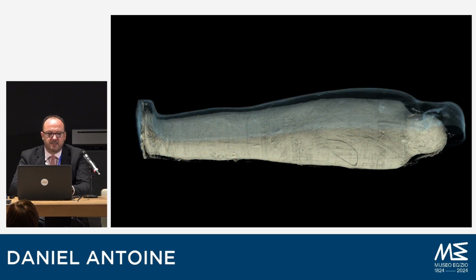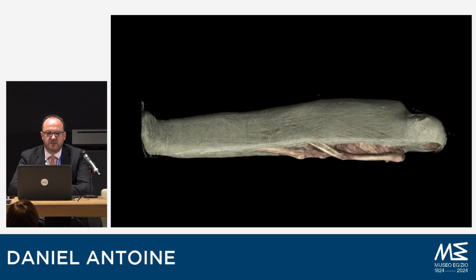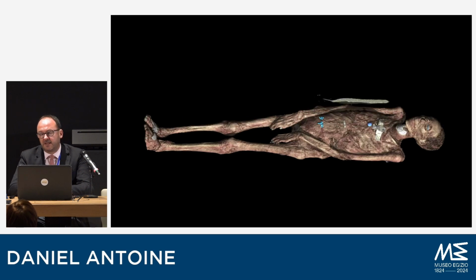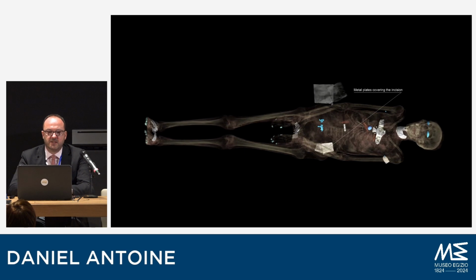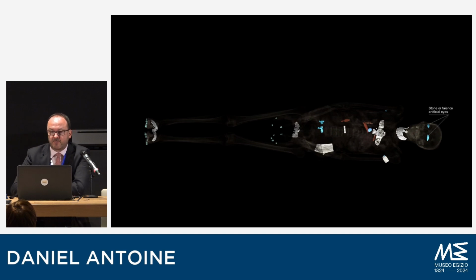And you can see here that we've also started integrating surface scanning, so merging the two data sets, allowing surface scans and CT scans to be integrated. And in her particular case, we use it to explore mummification. We highlight different objects placed by the embalmers on top of her body. And we use motion to actually highlight some of these objects, such as this incision plate, but also some of the wonderful winged figures placed on her body. I'll just let one more reveal.